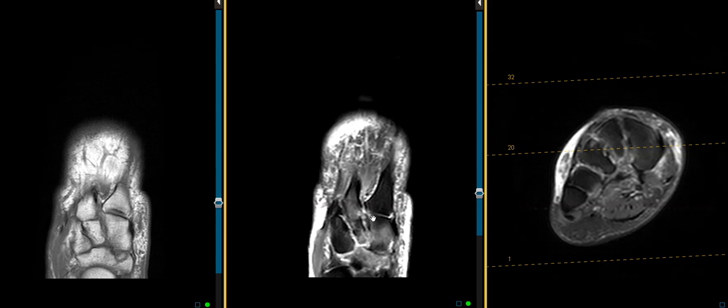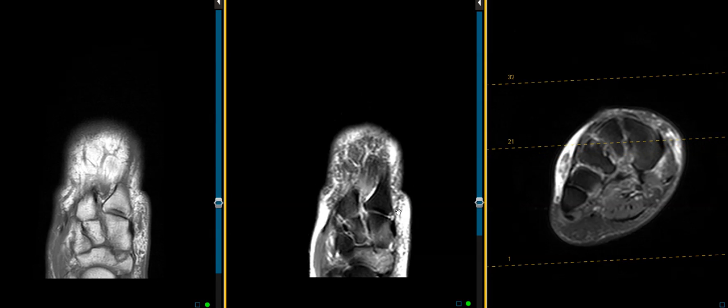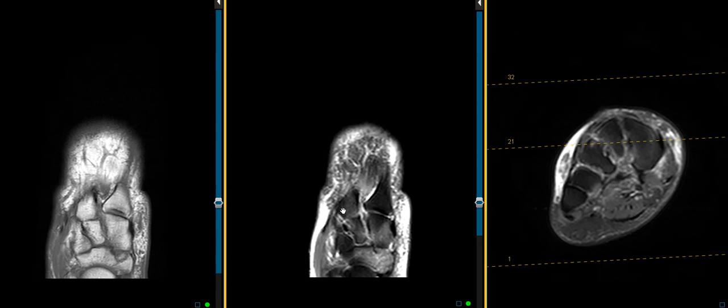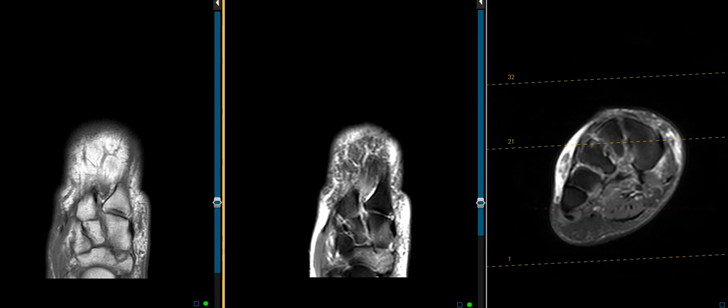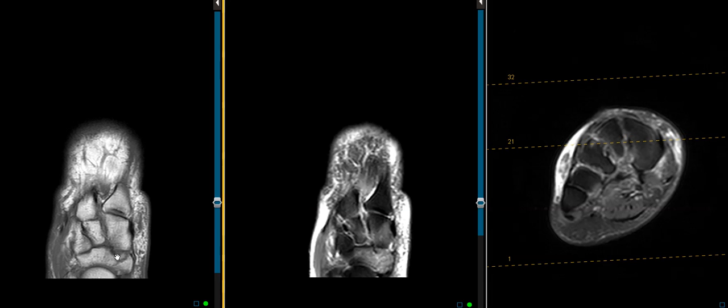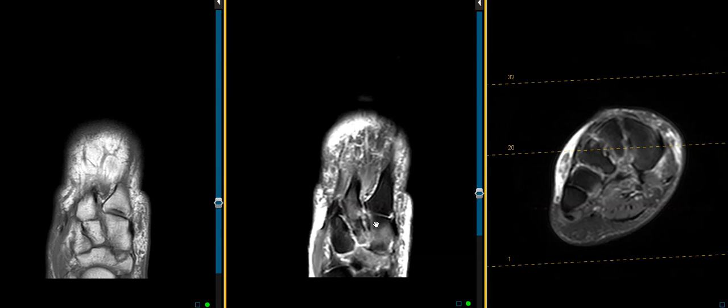Very easy to jog past unless you're really looking carefully for it, and something critical to see because this has big implications about their well-being. The surgeon's going to have to go in there and reconstruct this ligament to give the midfoot stability. And also don't get happy eyes when you notice a fracture. It's easy in radiology, from my own experience, to see something and say, hey, I'm done, I see a fracture, that's the problem. And forget to keep on looking for something that is even more important like this.